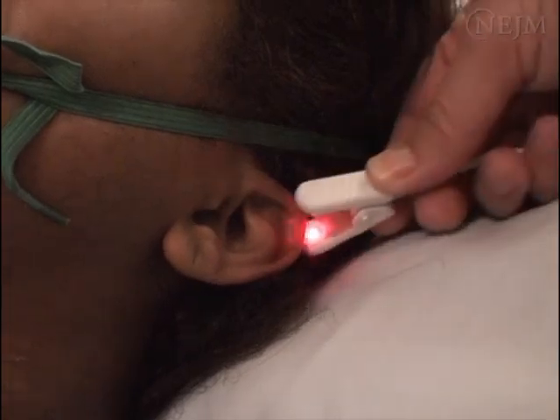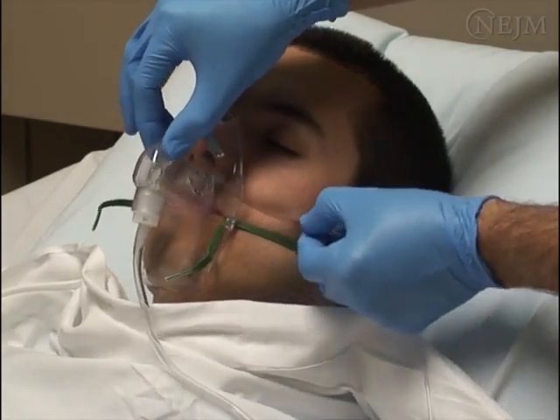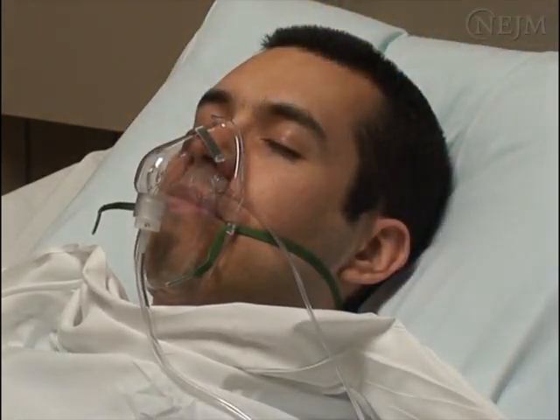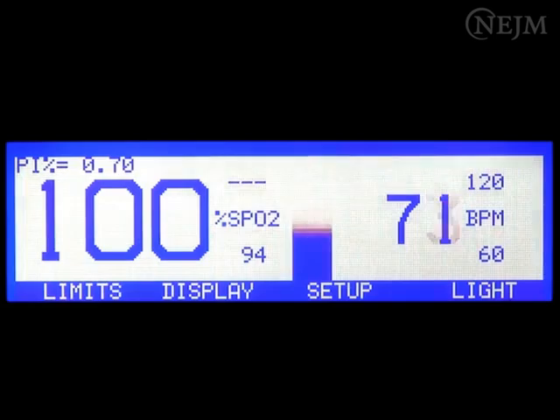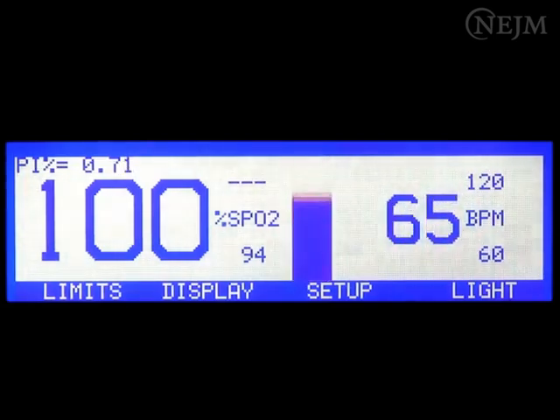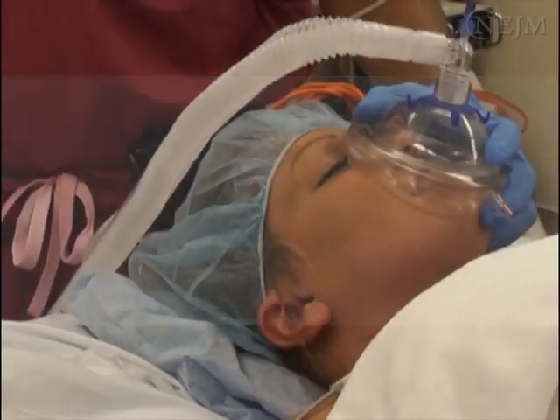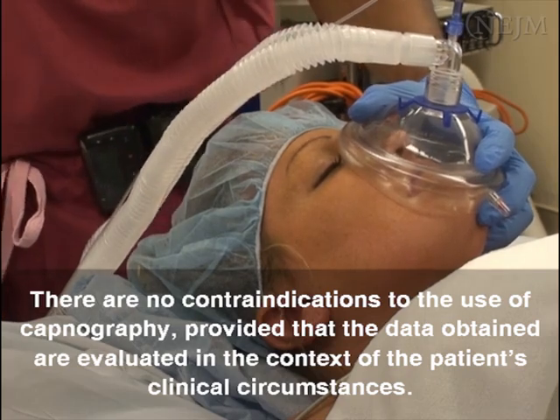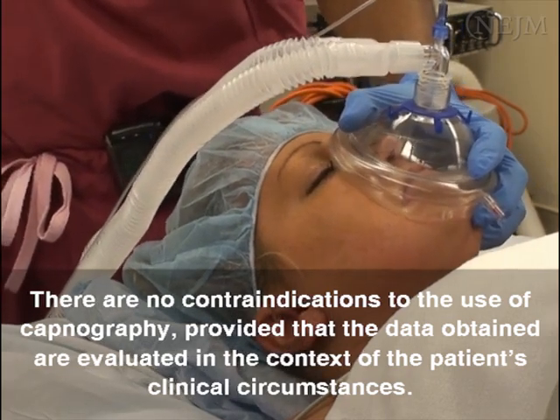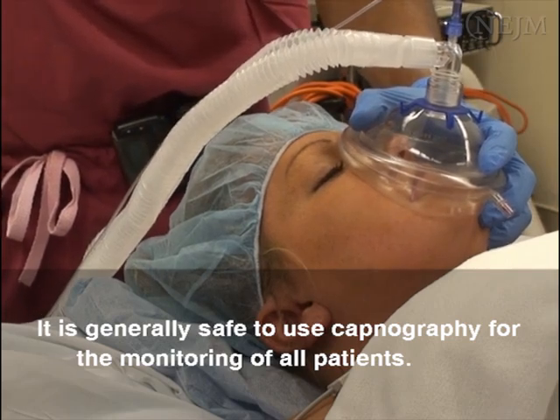While pulse oximetry is a good method for the assessment of oxygenation, capnography provides more direct information on a patient's ventilatory status. Capnography is particularly helpful in patients who are receiving supplemental oxygen, during which a normal hemoglobin oxygen saturation can be present in spite of marked hypoventilation. Contraindications. There are no contraindications to the use of capnography, provided that the data obtained are evaluated in the context of the patient's clinical circumstances. It is generally safe to use capnography for the monitoring of all patients.